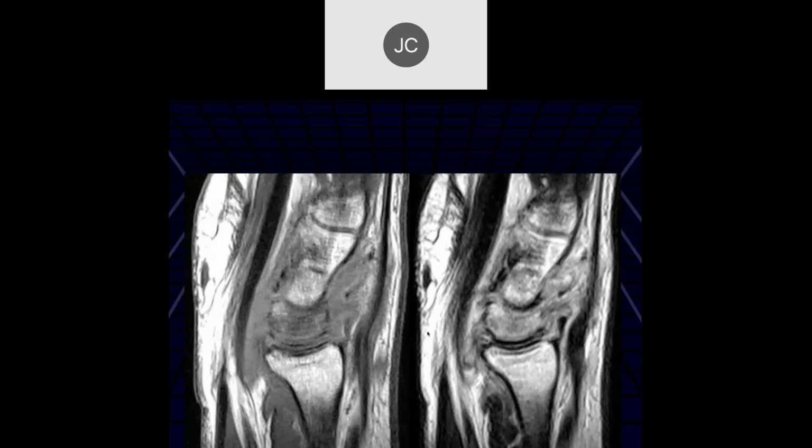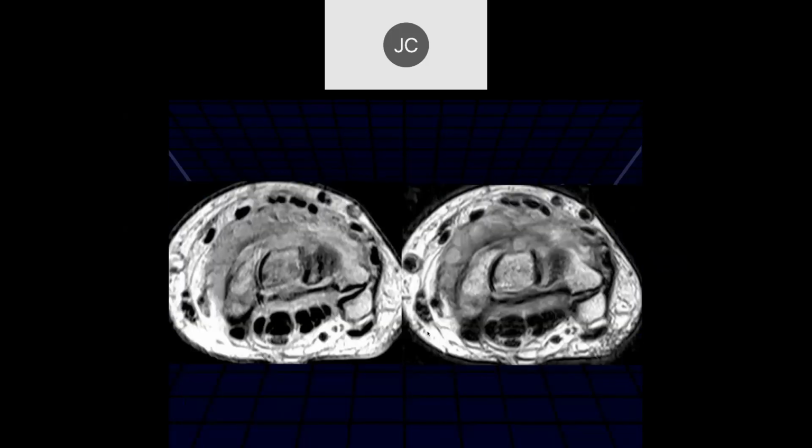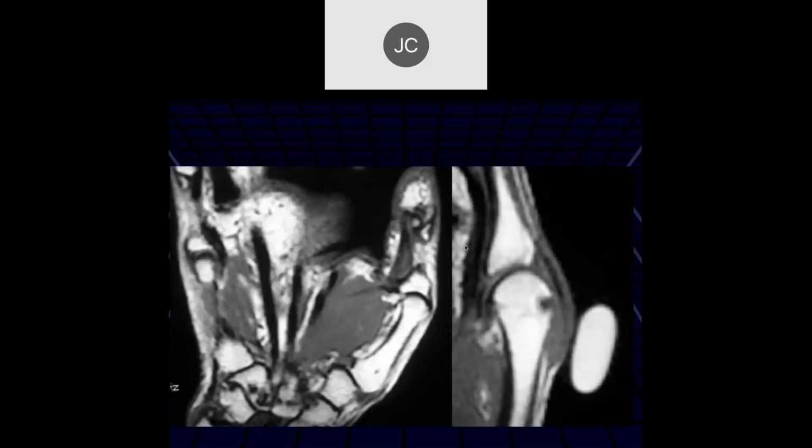Here are the sagittal images. Right, so we see this synovial thickening just surrounding the joint. And again, these bone erosions, could this be another inflammatory arthropathy? Maybe so. This was gout too, and this was all the synovitis associated with gout, where the erosions are a little bit less prominent. Okay, Tayson.